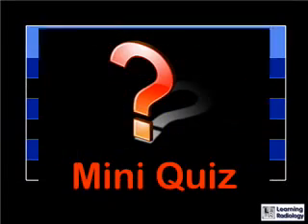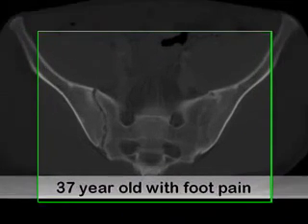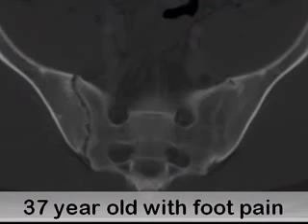Now it's time for your mini quiz. This is a 37-year-old with foot pain. Pause your computer or MP3 player and decide which of the diseases we've discussed this most likely represents.